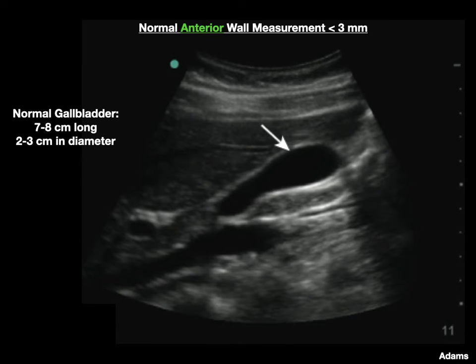It is important to measure the gallbladder wall thickness along the anterior or superficial wall rather than the posterior due to an artifact we covered in the physics session called posterior acoustic enhancement. This is an increase in echo behind fluid-filled structures like the bladder, gallbladder, cysts, etc. Posterior acoustic enhancement results from the relative ease of ultrasound wave movement through the fluid-filled structure, which is low impedance, and its interaction with the attenuating posterior wall of the structure.